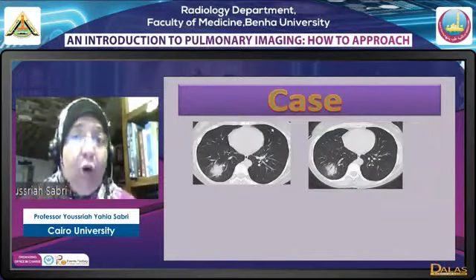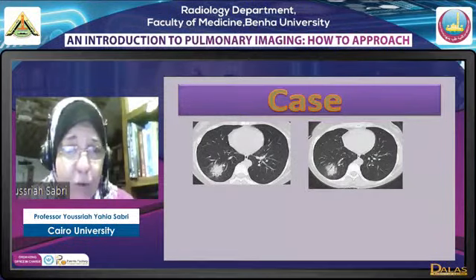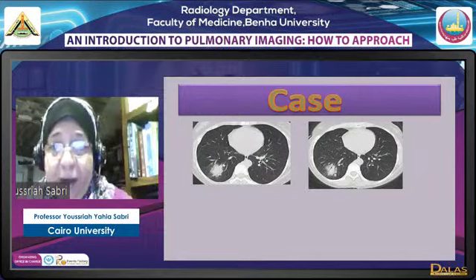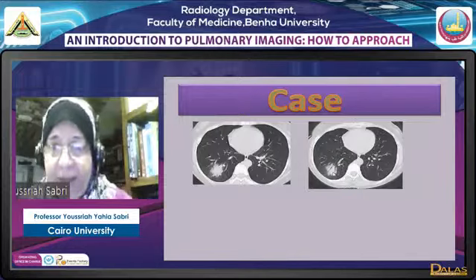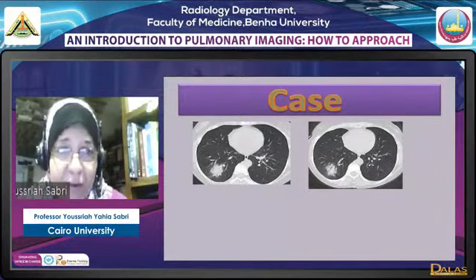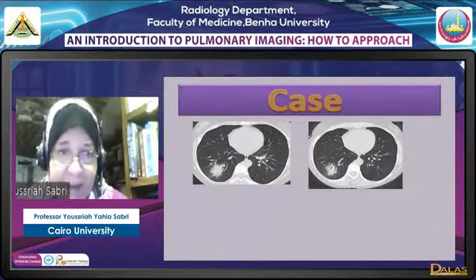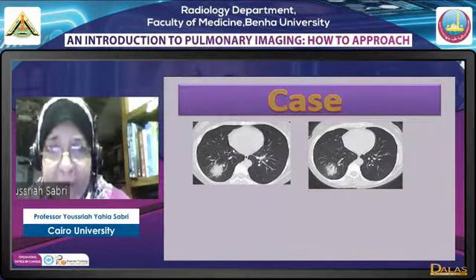دي كانت حالة كوفيد. اوكي، اللي لقيناه غير الليجنز الكلاسيك بريفرال ما كانوش كتير، لقينا this mass lesion with partial ill definition of the outline. لما نبص جواها هنلاقي there are dilated bronchi here. الماس ما يعملش dilated bronchi. الماس يا هينفلتريت وهيقفل البرونكاي يا هيفيزم، لكن dilatation is a sign of traction, sign of fibrosis. طيب طبعا البيشنت اللي كان عنده المنظر ده كان يعني جاله هلع من المنظر، he was afraid of bronchogenic carcinoma and so، بس هذا المنظر actually is a part.